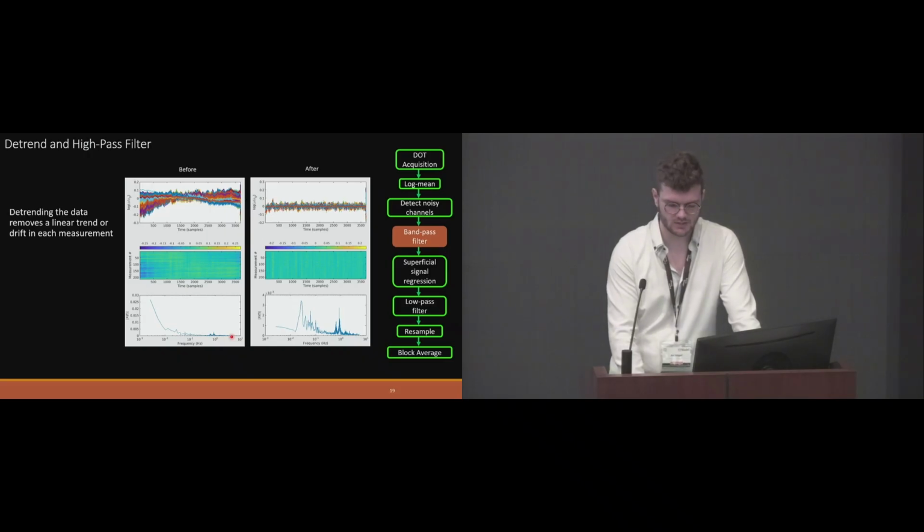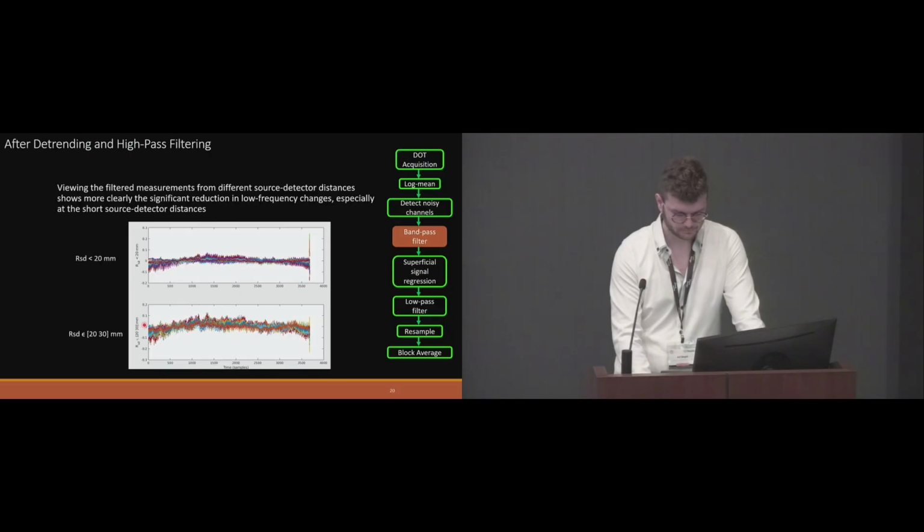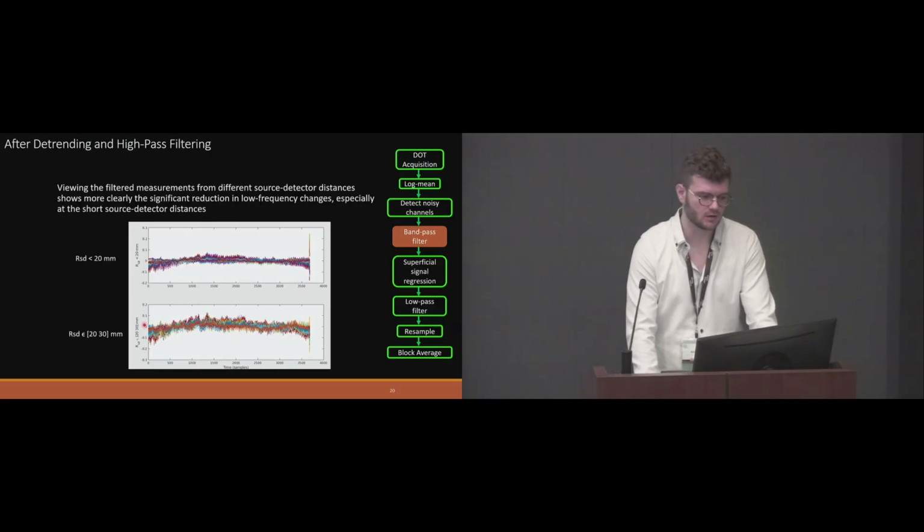Frequencies below that cutoff frequency are significantly attenuated. And then that time traces plot shows subtle changes with a flattening over the duration of the measurements after we've done our high-pass filter. And so here we can see at the bottom our high-pass filter cutoff right over here, and then afterwards we can see our data jumps up after filtering. We can look at it as well, and again we can see the flattening of our curves once we're zooming into our time traces.